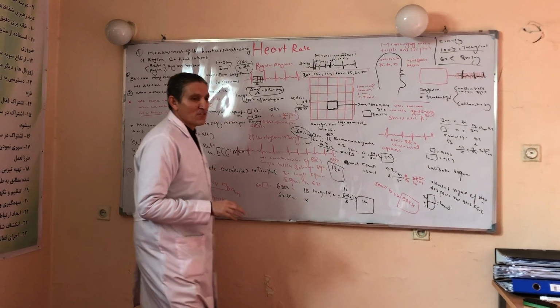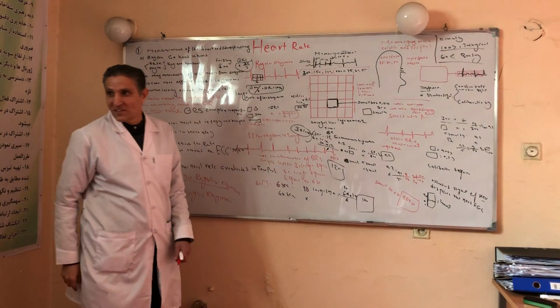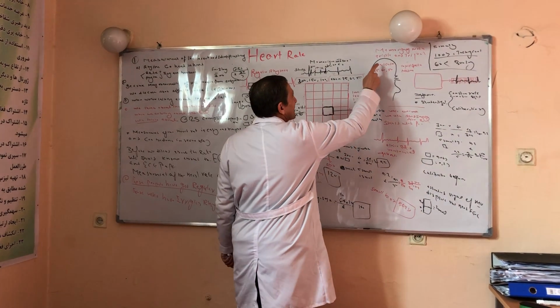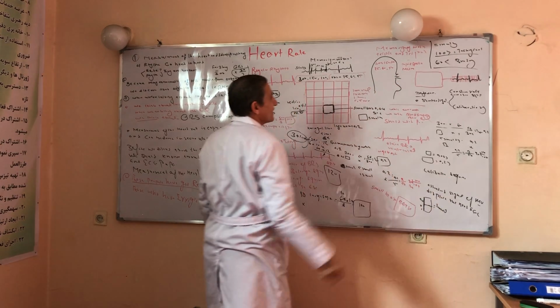In addition to that, we have a very rapid or quick method. This method is called the memorizing method. In this memorizing method, we should not forget the triples. For example, 300, 150, 100, 75, 60, and 50.